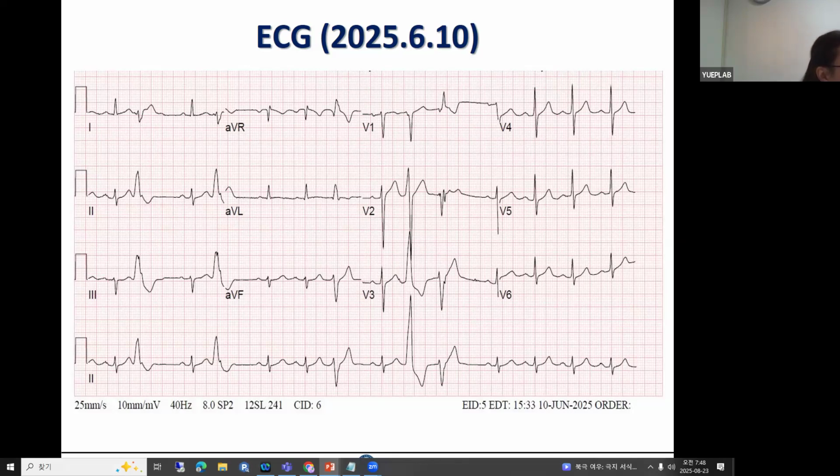Let me ask you this question now. Your QRS is closer to the T wave now compared to the previous PVC, almost R on T. And the QT interval and other things look pretty much the same. And then just two different PVC morphologies with completely opposite direction.